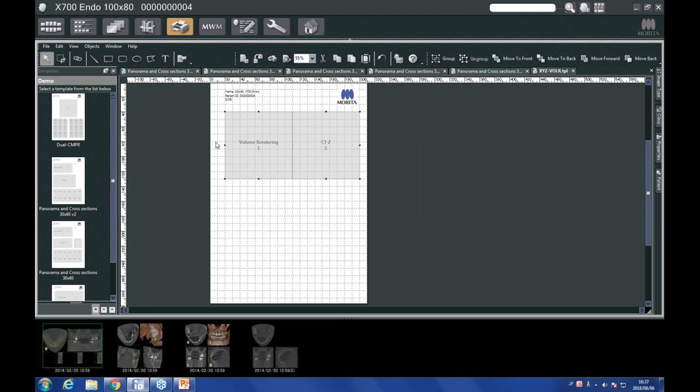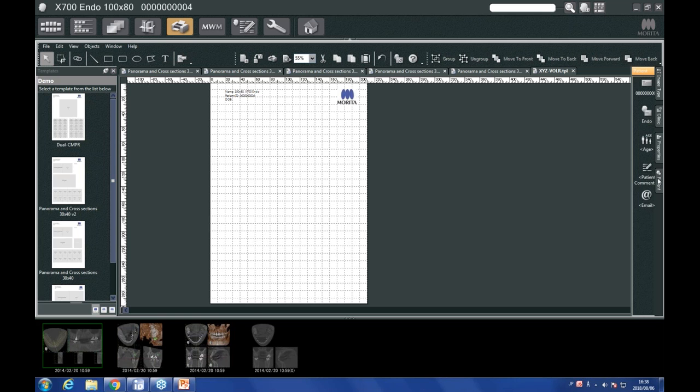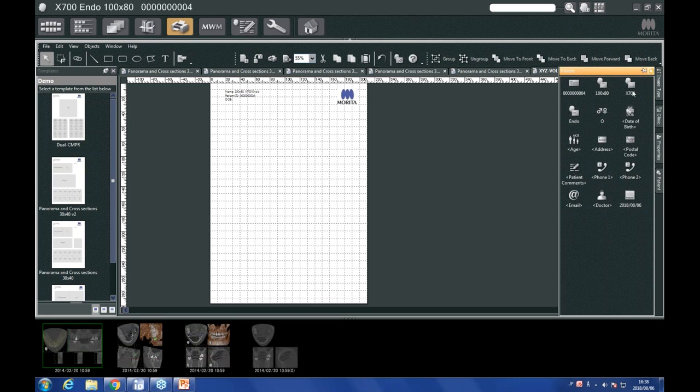Now, since this presentation is a little bit on how we actually use Idixel, I wanted to show very briefly how I would create a template like this. We're not going to go into deep details. This is just very roughly how I would lay it out. So on the right side of the screen here, we have several different panels. Patient data, which is all of the patient information. This will be filled in depending on the patient that you've selected.